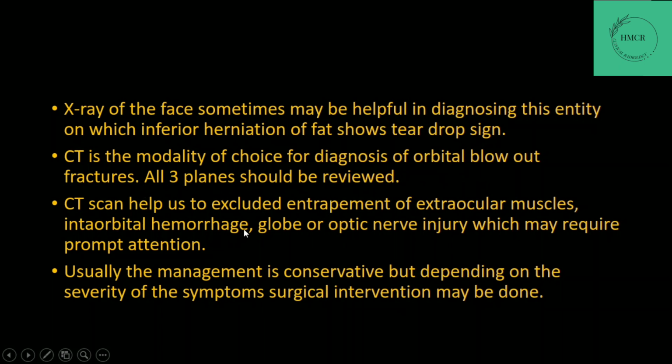CT scan helps us to exclude entrapment of the extraocular muscles, intraorbital hemorrhage, globe or optic nerve injury, which may require prompt attention. Usually the management is conservative, but depending on the severity of the symptoms, surgical intervention may be done.